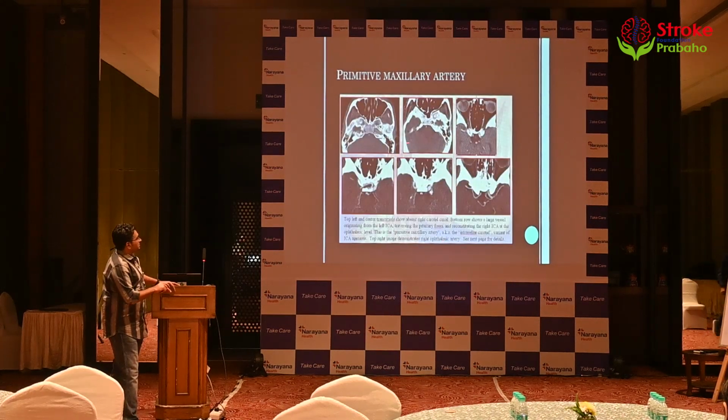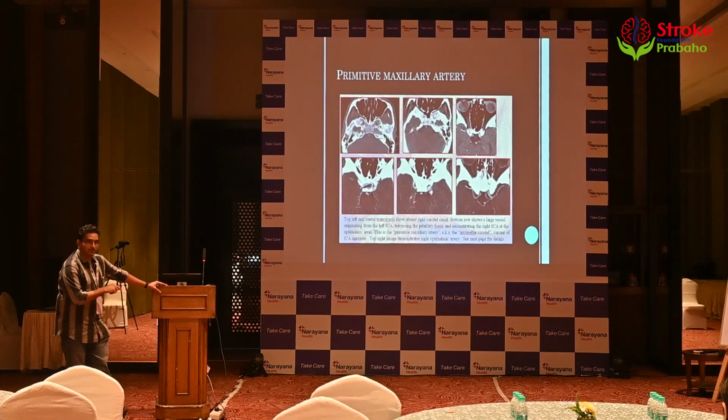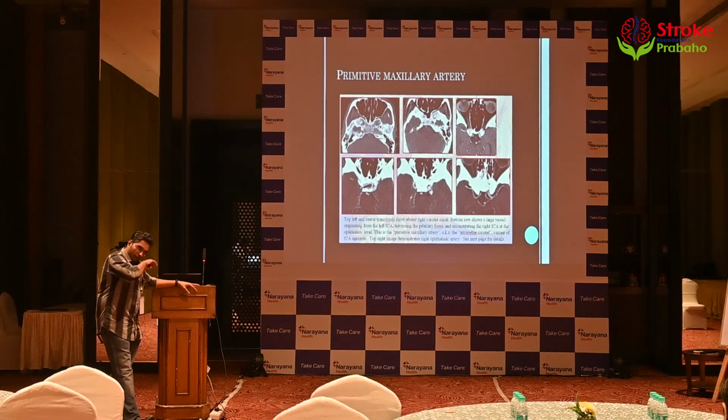There is one more vessel that embryologically, very rarely, you might see. This is a vessel that traverses, called the intercavernous carotid, from one cavernous ICA to the other ICA. This is like an anterior variant of your persistent trigeminal. A trigeminal goes at almost the same level, but it goes back. You can have a vessel that goes horizontal.